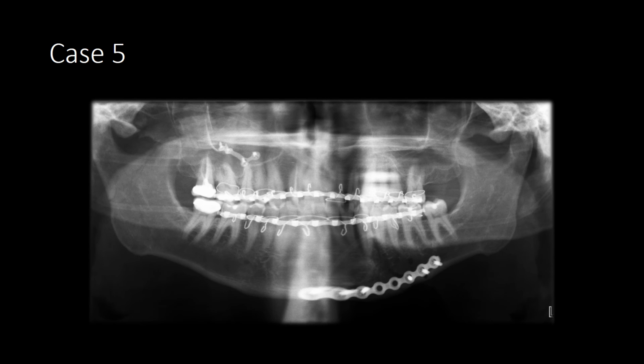This is a post-operative panoramic radiograph. So what happened to this guy? What's going on? Well, you can see there's a plate at the inferior border of the left hemimandible in the parasymphysis region. There's a maxillary plate, and there's arch bars and wires. So this patient probably had a right hemi-Le Fort, probably a left parasymphysis mandible fracture, but there's plates on those fractures.